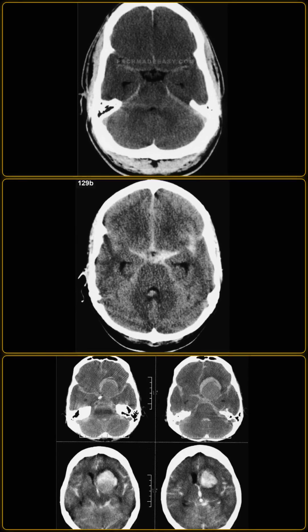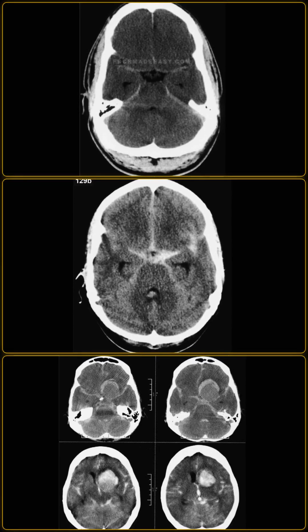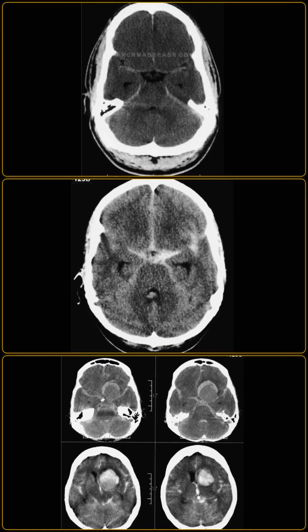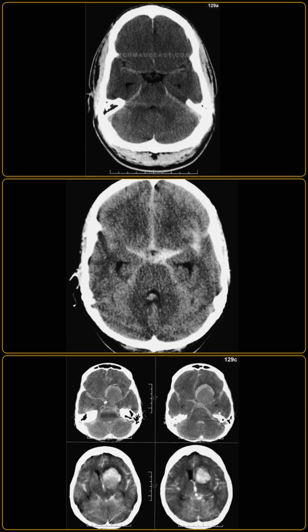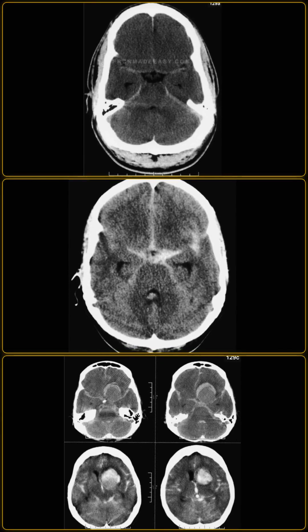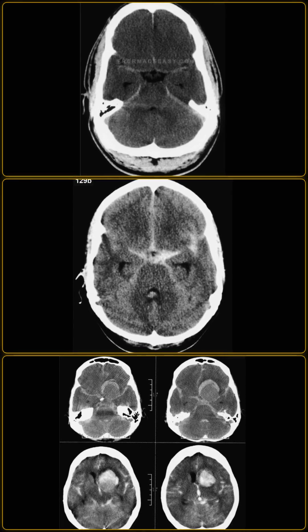To avoid this error, one must carefully measure the Hounsfield units of the basal cisterns, which will show normal CSF density in pseudo-subarachnoid hemorrhage, but will be high density in true hemorrhage. A mistake in this direction can lead to unnecessary high-risk angiographic investigations in an already critically ill patient.